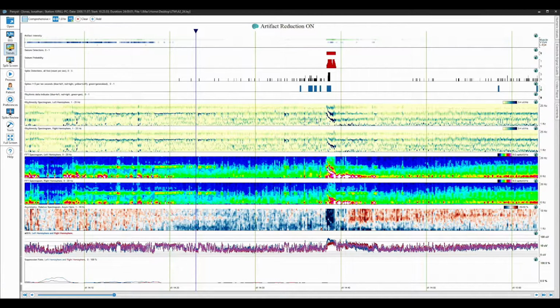Of course, the seizure detector isn't perfect. It won't pick up everything you might consider to be a seizure. But when you are looking at the EEG, you might notice this kind of pattern in the trends. That means you can look through the trends after that time to quickly find similar patterns, without having to necessarily look through every page of the EEG.